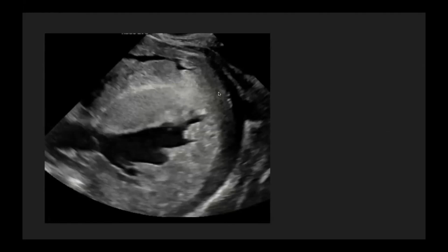So the enlargement is not limited to the interventricular septum only. It also involves the free wall of the ventricles, both right as well as left ventricles. There is a minimal amount of pericardial effusion, not that much, but the majority of the shadow that we are seeing was due to this big heart with thick muscles, very thick echogenic muscles.